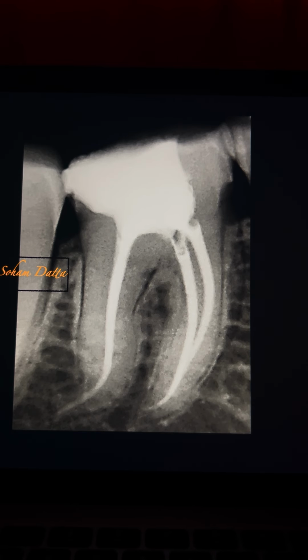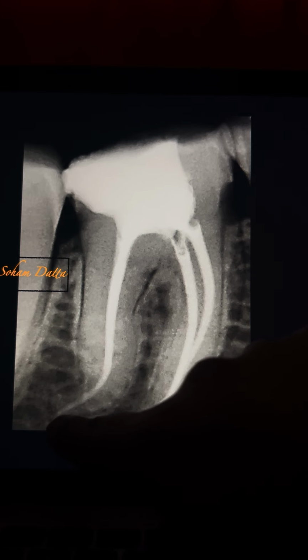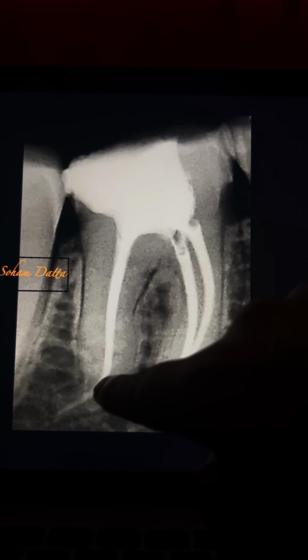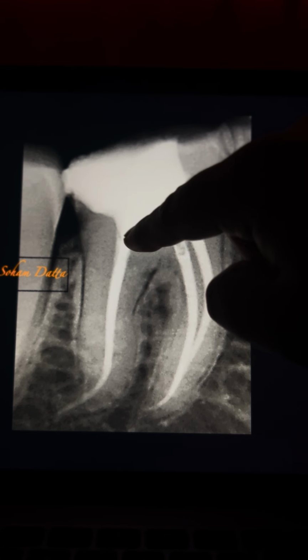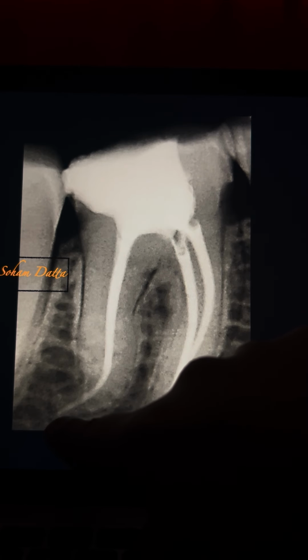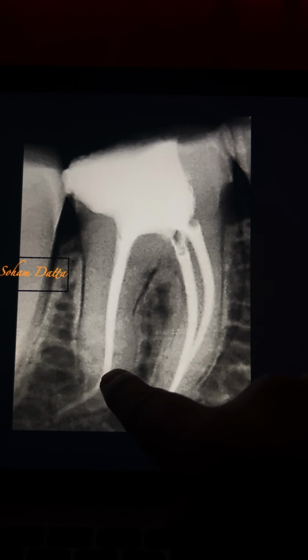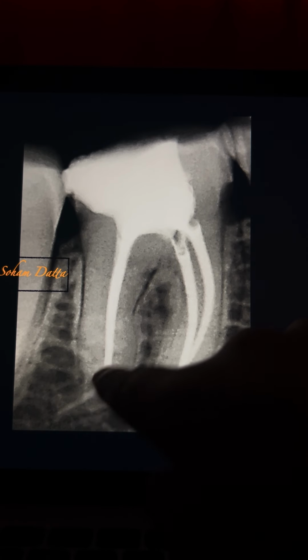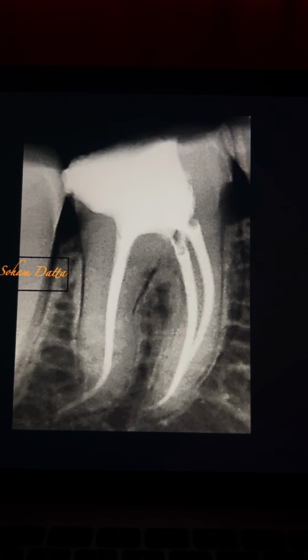Now on the distal side, yes, 2 GPs are still here. The first GP starts from the orifice to the apex, a single GP from here to here. The second GP which I put on the distal side goes from here to here, whereas the first GP goes from the orifice to the apex. So up to this point there are 2 GPs. From this point to this point, the first single GP reaches the apex.